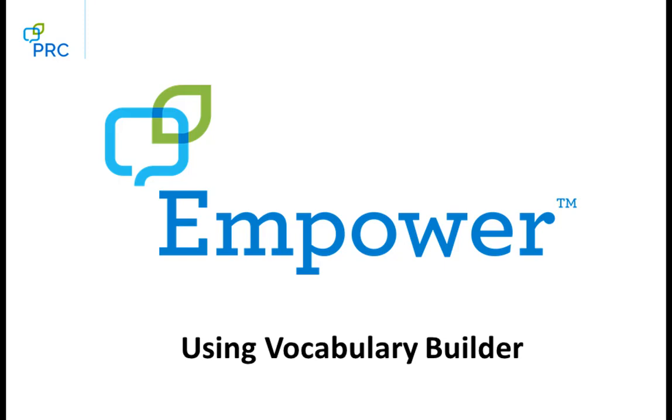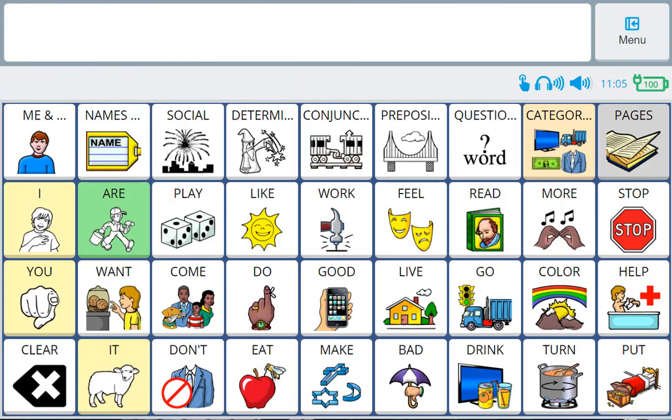To show you how to use Vocabulary Builder in Empower to temporarily limit the words showing on the screen. You may want to do this to reduce distractions for individuals or to emphasize certain words you want to teach. I am currently in Unity 36 sequenced, but know that the way you use Vocabulary Builder in the other Unity configurations and LAMP Words for Life is the same in Empower on an Accent speech generating device.